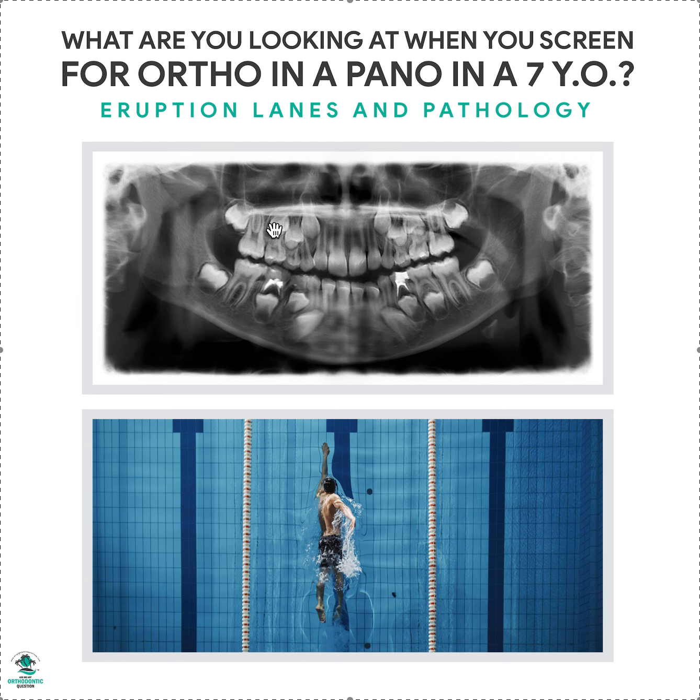When you look at a nicely spaced pano, and a patient that has the proper amount of teeth in mixed dentition, and the proper width of their jaws transversely, you shouldn't see all this tippage. So I'm looking at tippage. I want to see nice vertical teeth for the threes, fours, and fives, not tipped, okay? I want to see nice lanes of eruption that will show that they hopefully will be successful and erupt. It's no promise, but at least we're screening and we're not seeing any red flags.